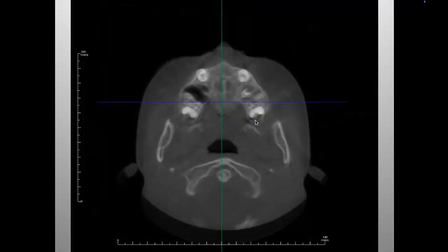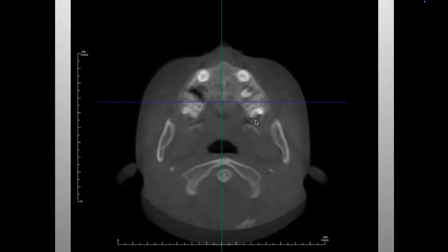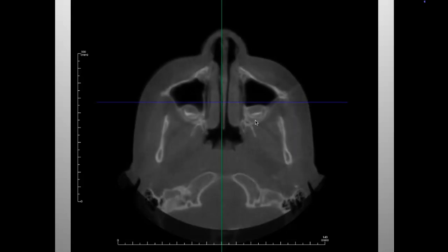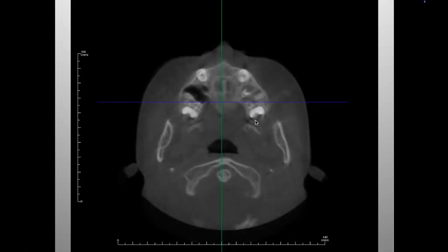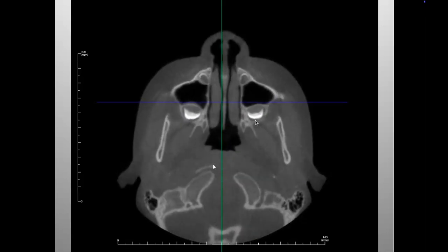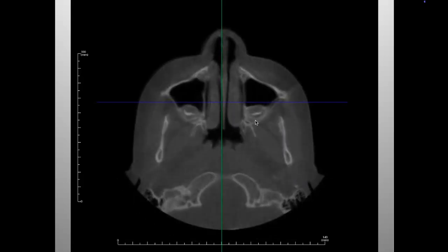This shows the upper jaw, and again, you can see the width. You see the most change in the posterior area, a little bit less in the anterior area in this case. But this also shows, look at the widening of those sinuses and the internal nasal passageways. So this is what contributes to allowing patients to breathe better. Now again, her chief concern wasn't breathing, but if it were, this would be what improves it. As you go through, the internal and the external nasal valves, everything's going to broaden as those sinuses and the nasomaxillary complex broadens as well.